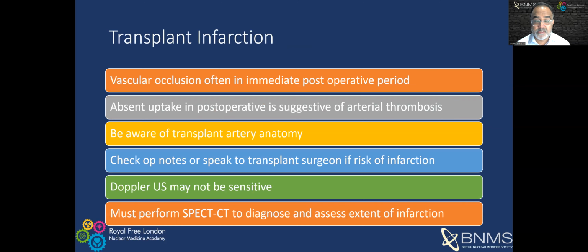Transplant infarction is something that's important to look out for in the immediate postoperative phase. You can have vascular occlusion, which occurs immediately postoperatively, and in this case, you'll have absent uptake on the postoperative scan, and this suggests arterial thrombosis.